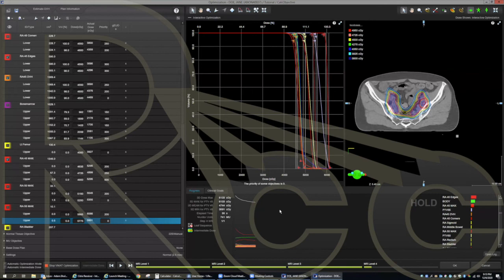But if I tell the doctor I can achieve a lot at the expense of PTV, but I'll still treat CTV, then I will achieve it as well as possible. Whatever my clear instructions are, there's never been a plan that I haven't been able to reach with this method within, say, 2 iterations. So this initial plan, and then maybe a slight fine tuning of a couple max doses that were just slightly off that I went back into to tweak.